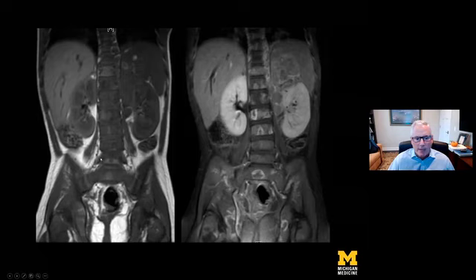As I would point out in this slightly older child, the marrow even on T1 should not be so dark uniformly. There should be more fatty marrow. So as you learn marrow maturation processes with age, you'll be able to quickly recognize that this marrow is diffusely abnormal. You see more focal enhancing rim-like metastatic lesions, but actually almost all of the marrow spaces are involved.